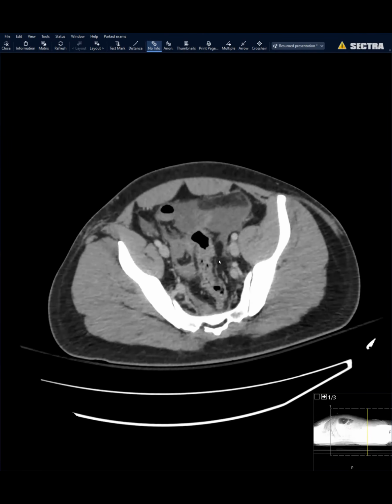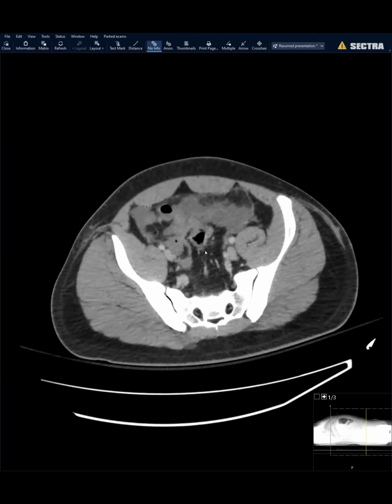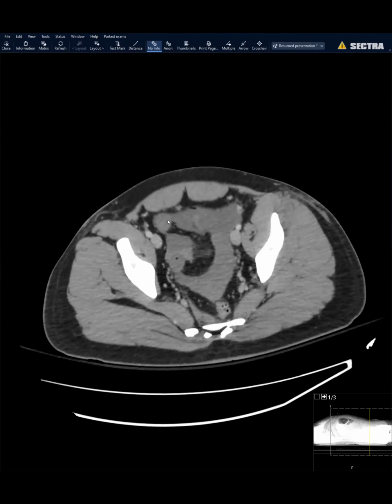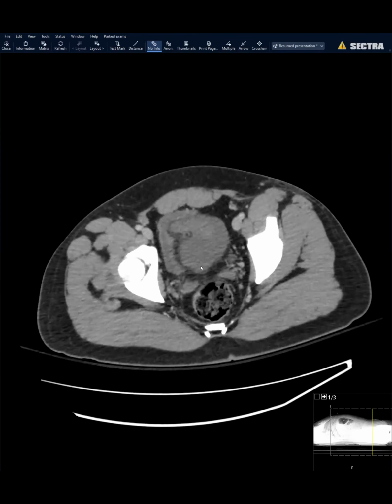Absence of good wall visualization is a little tricky in this patient because of the hemorrhage that you're seeing around it. So sort of similar attenuation, but this is actually very suspicious, particularly given the free air, that he may have bowel injury.